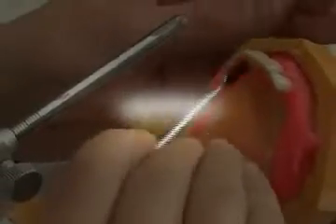The teeth are positioned in wax for the so-called wax trial. The patient has to feel comfortable with his new denture. During the wax trial, the positioning of the teeth can be changed slightly. Only after a satisfactory patient trial can the teeth be permanently transferred into the synthetic material.